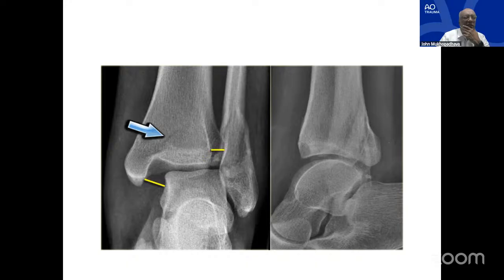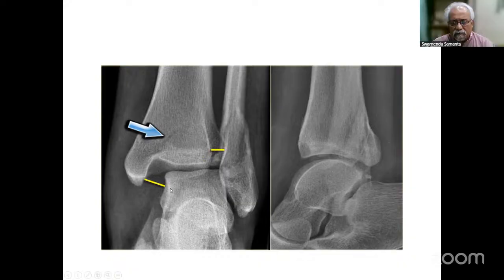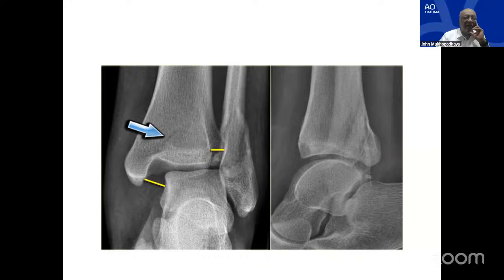Talotibial joint? What is that? You are mentioning the tibiotalar joint. Please be clear about your words. Don't just blindly say things.